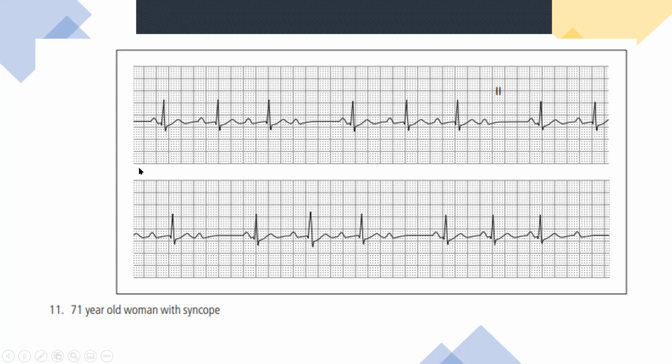So this is a rhythm disturbance. So it's a cardiac block. Right?